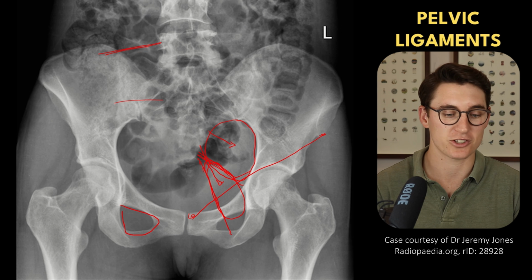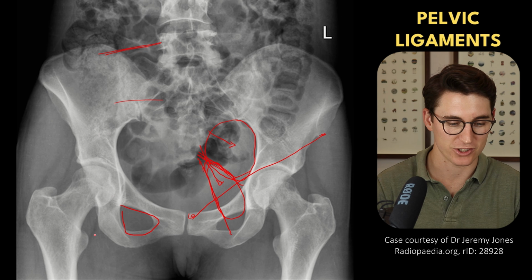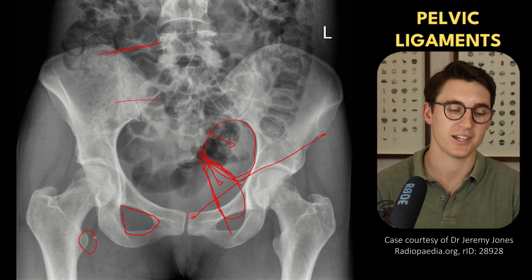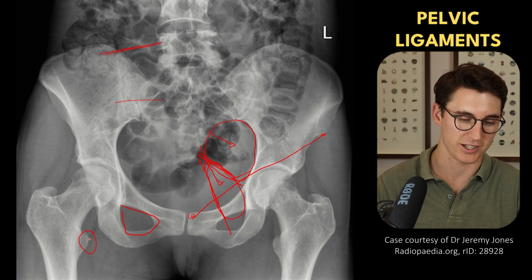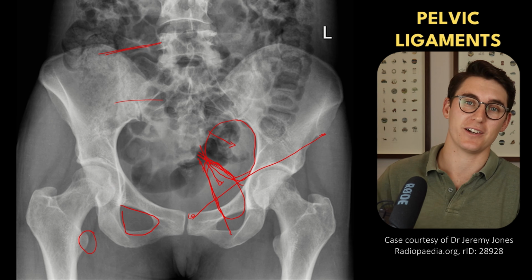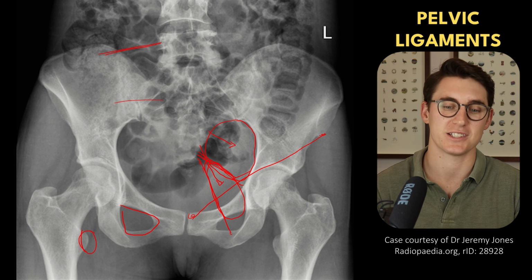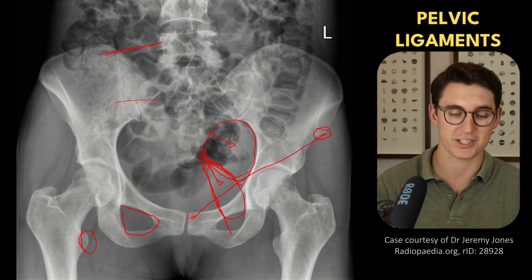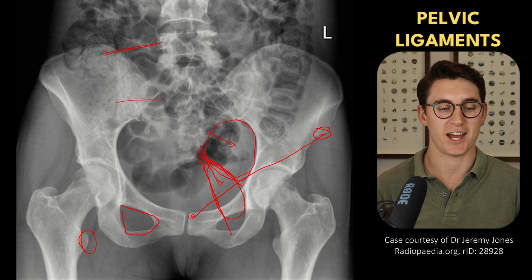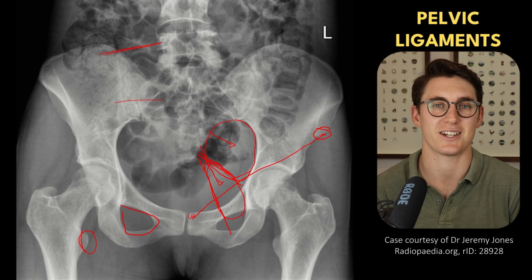And the most common example of this before we end off is our iliopsoas muscle that attaches to this lesser trochanter here. Often this trochanter can be avulsed off of the bone here when tension has been put through our iliopsoas muscle and causes a break of this bony prominence here. And that can happen on our anterior superior iliac spine, our greater trochanter, a whole bunch of areas. And knowing these attachments helps you to identify where those different fractures can occur.